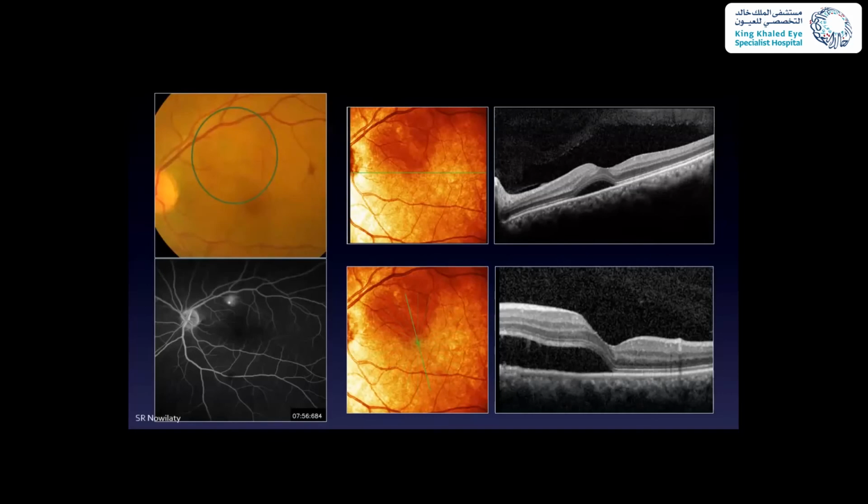And remember when I told you where you see the arrow? The arrow goes down. Well, maybe in this case it's not very clear, but the arrow is the ones here. So this is the right part of the frame. The right part is therefore the inferior part, and this is the superior part. So the OCT can definitely localize the area of the subretinal fluid, and you can tell that although the fovea is thinly detached, much of the fluid is actually in the superior part.